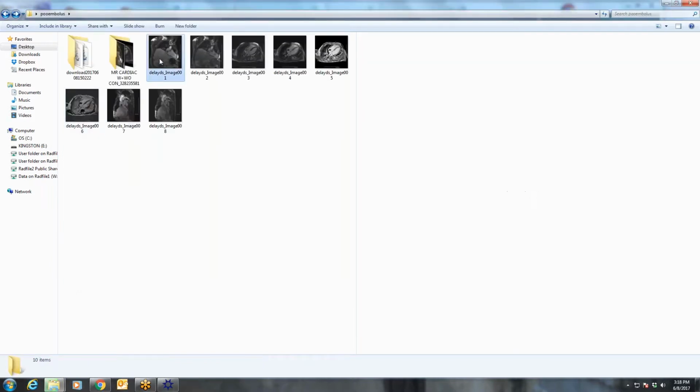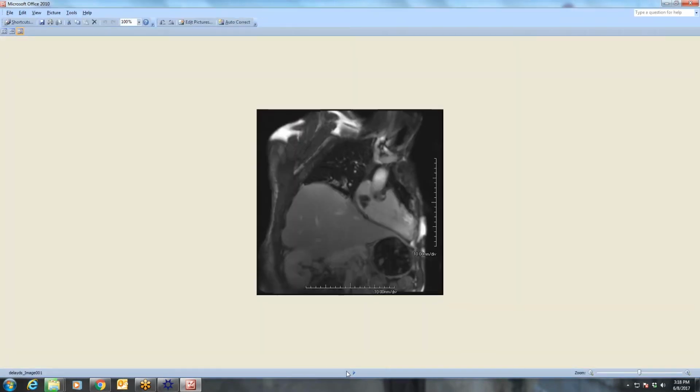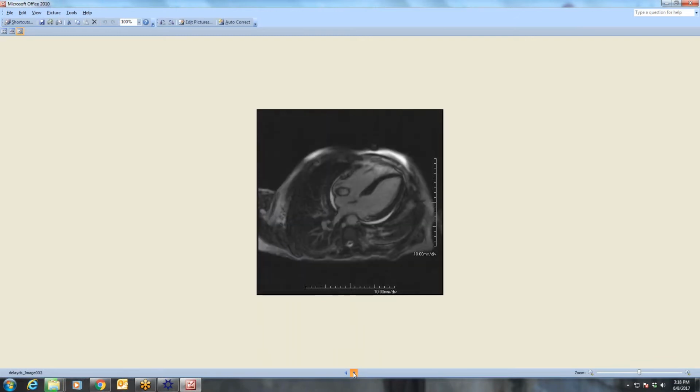And then if you really want to, I think the best way to delineate between a tumor and a thrombus is really to do your inversion times at very normal and very late, using the magnitude images. And you can see at a magnitude image with a nulling point of 300 that this thing hasn't yet nulled, whereas it nulls out on the 600 at a much later inversion time.